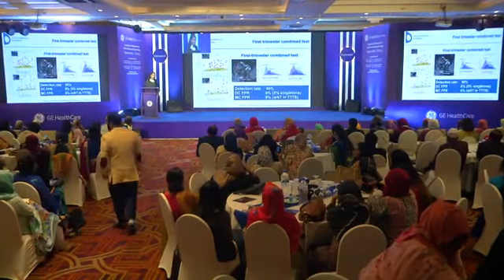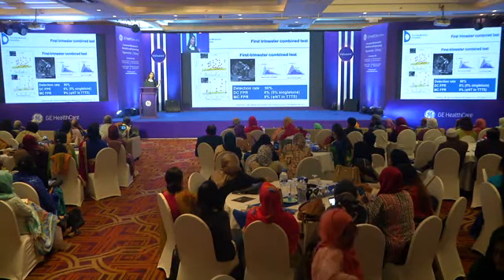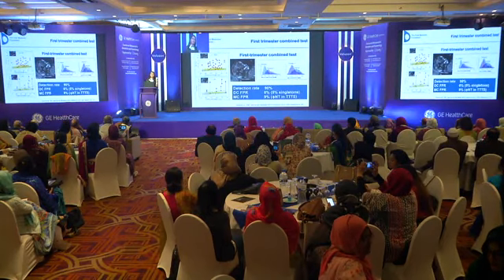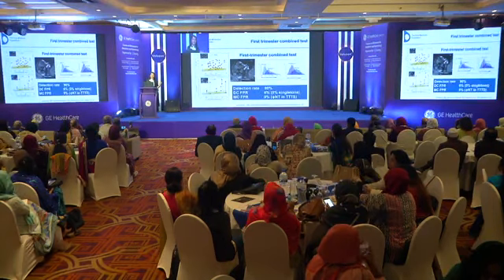The graph says that in one twin from a monochorionic pair, we could have one baby with a nuchal translucency within the normal range, but the other baby could have a nuchal translucency that is very much increased. So in order to be accurate, we need to give the average number for the whole pregnancy.